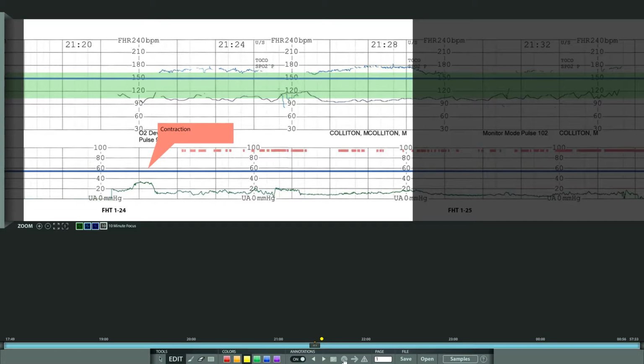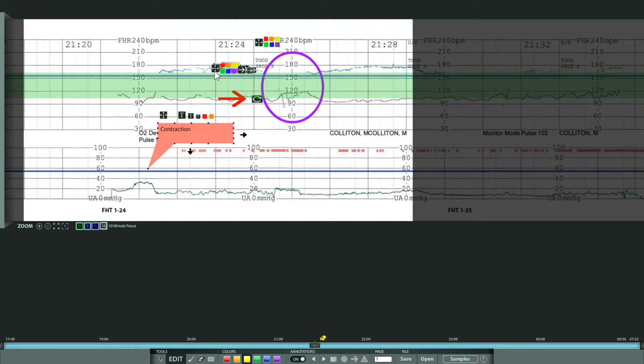Some of the other annotations I can have is a circle. And also, if you go into with the circle and the annotations, you can go to edit and change the color of that as well and move it along wherever you need to. I can make an arrow. And also can move that around, change the colors of it, and a caution sign. And there are 2 different colors for that as well.